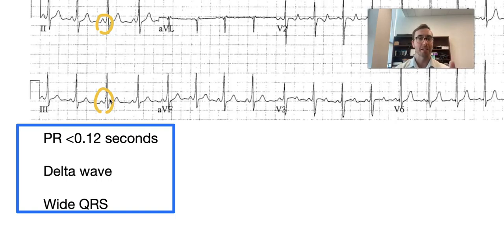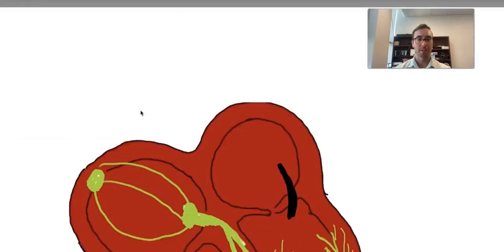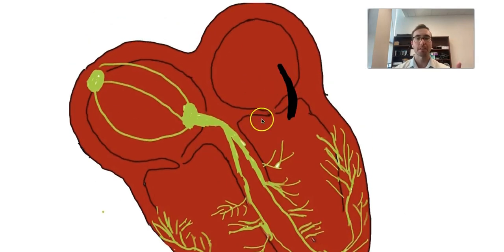And that's highly indicative that the ventricles are already being prematurely excited because of the accessory pathway, which is the bundle of Kent. And this one doesn't have a wide QRS, but again, sometimes they do manifest with a wide QRS and that upslope in the QRS segment because it's prematurely exciting the ventricles because it's using the accessory pathway.